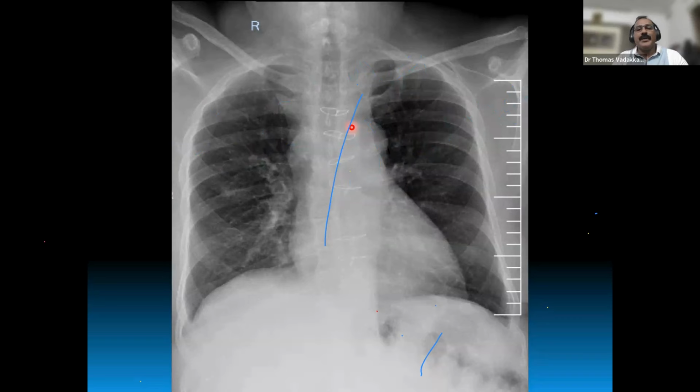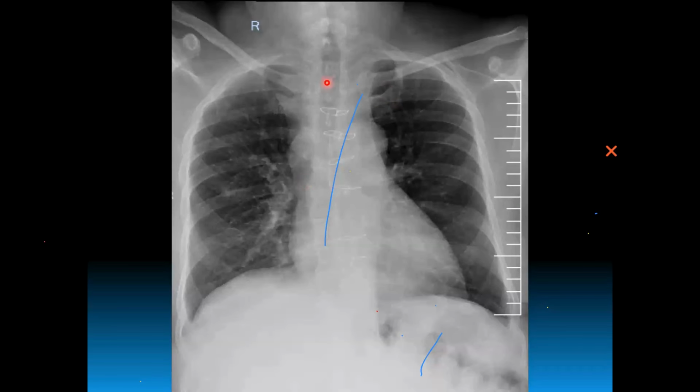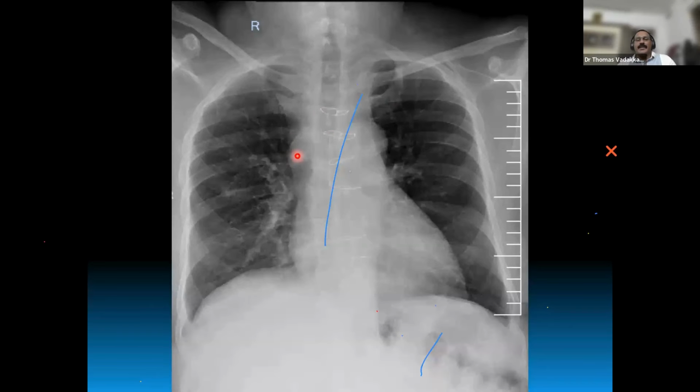This patient actually came to me 2 weeks ago. He's a post-CABG patient, which was done 2-3 years ago. Now his problem is facial edema while getting up from bed, and breathing difficulty and stridor. Mediastinal widening. Yeah, there is a mediastinal widening.